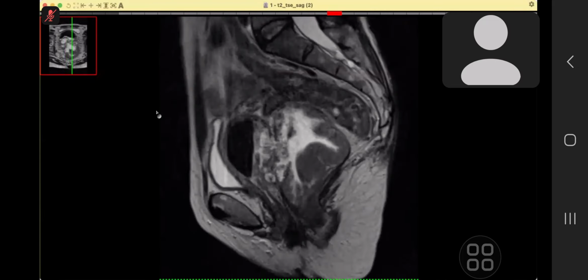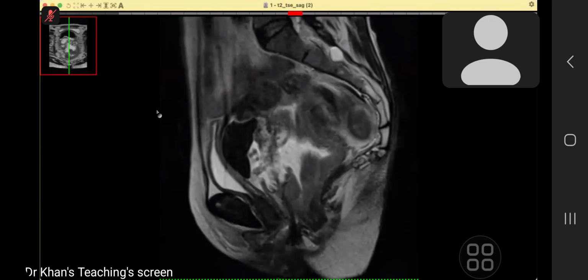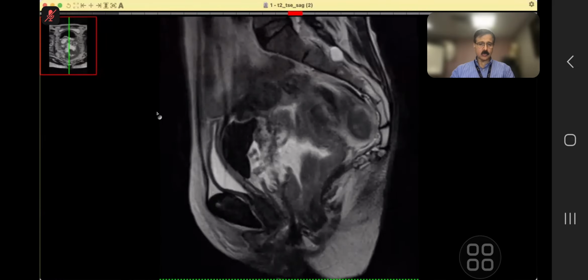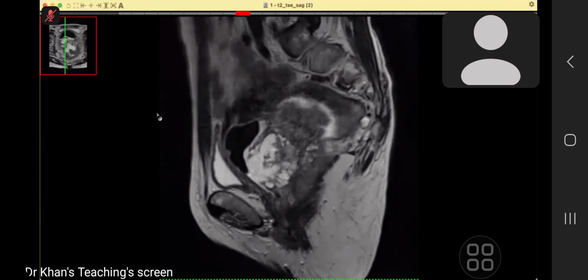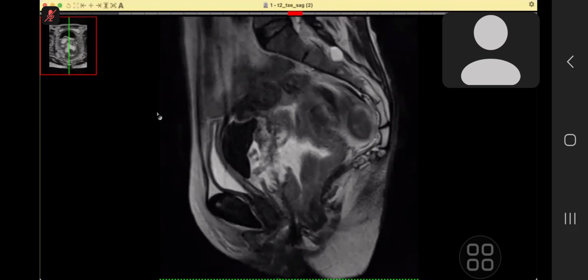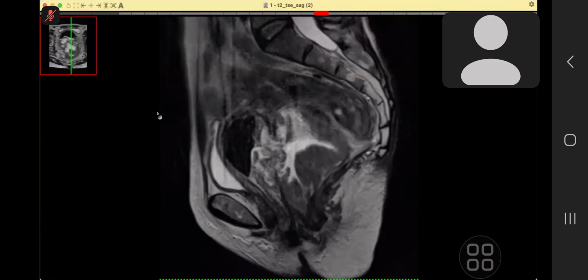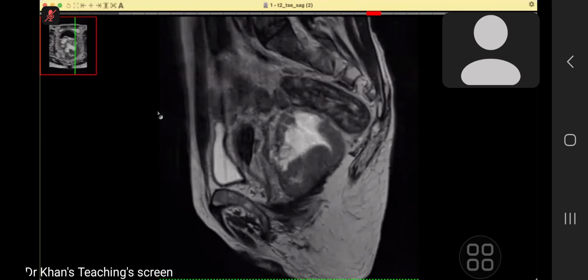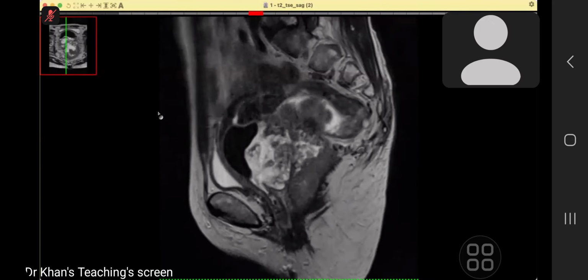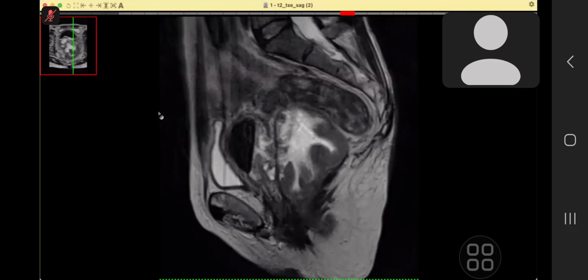I'd like to check if there is any lymph node enlargement and if there is any involvement of any other structures. What is your conclusion? Just give me your conclusion. I'm suspecting a rectal mass with invasion into the rectouterine pouch of Douglas, and then involvement of the posterior wall of the uterus. Presence of air also indicates the invasion in the endometrial cavity.